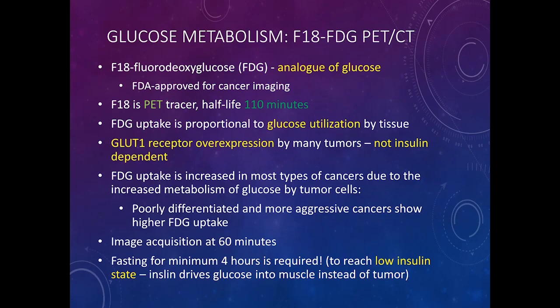But if you don't see uptake in these tumors on FDG, it does not mean that it's not malignant. It just means that it's not active enough to pick up this radiotracer. So it's a continuum. The more differentiated the tumor is, the more likely it is to pick up specific tracers like MIBG, OCTREOSCAN. The less differentiated it is, usually more aggressive, it will pick up FDG. And you will see a similar principle in other tumors that originate from specialized cells.